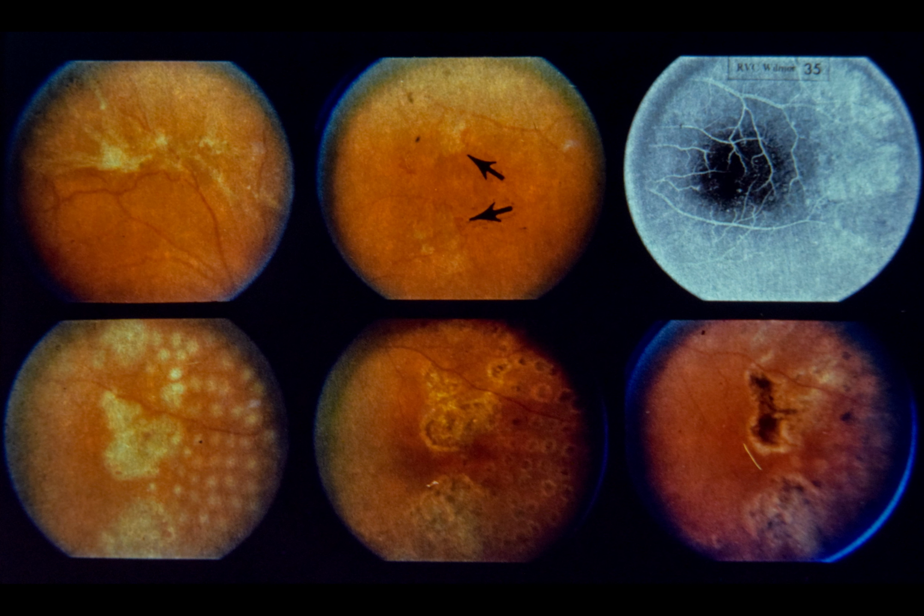As usual, new vessels appear at the interface between perfused and non-perfused retina. Lower left, note retinal whitening and fragmentation of neovascular channels in photograph taken immediately after photocoagulation. Scatter photocoagulation extending to the equator was applied in addition to focal treatment of new vessels. Lower center, note chorioretinal scars in place of neovascularization 1 month after treatment. Lower right, note absence of new vessels 1 year after treatment.